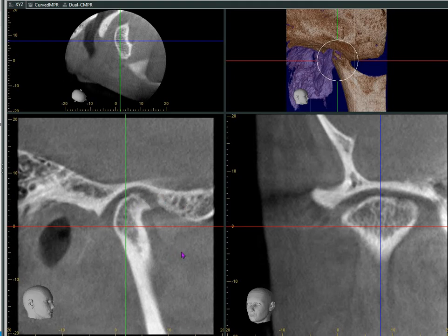normally again. Many chronic pain patients have worn out their joints and cartilage, and they may not even know that this has happened. This is often a slow process that does not get detected clinically. In some patients, joint sounds such as popping and clicking are heard, but in others, the joints appear normal. This is seen in joints where the bones have smoothed themselves off without degeneration and they make no clinical sounds. Such joints are seen in the next CT scan.